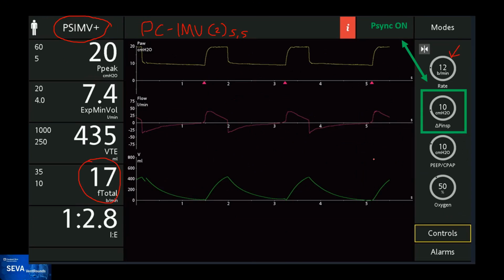Also on this ventilator, another hint is that it says delta P instead of inspiratory pressure, right? Yes, in SIMV and the regular SIMV, we usually have two controls: one for the mandatory breaths and another for the pressure supported, spontaneous breaths. Right, so now you only have one. Yeah. This mode and this option, sadly, the manufacturer doesn't change the commercial name, so many people can be tricked thinking that this is the popular pressure SIMV or pressure control IMV type 1. Okay, that's why the type.